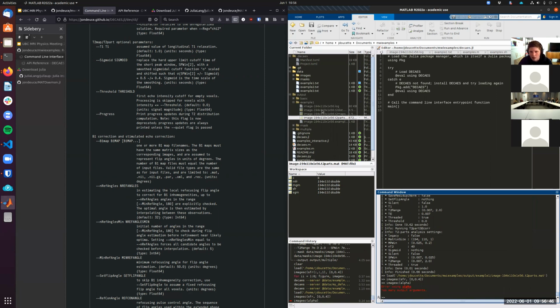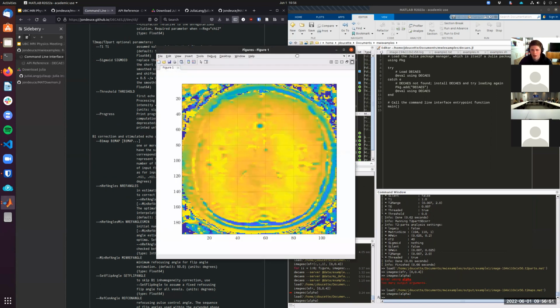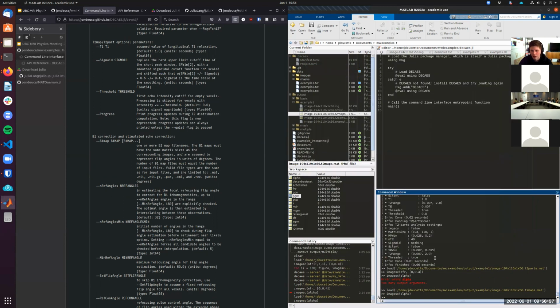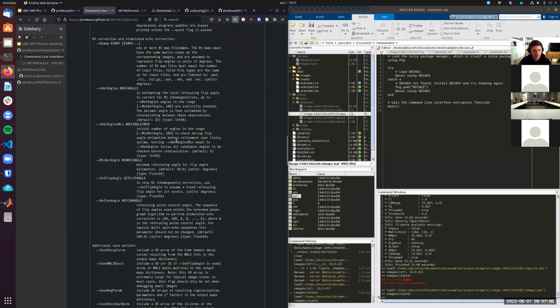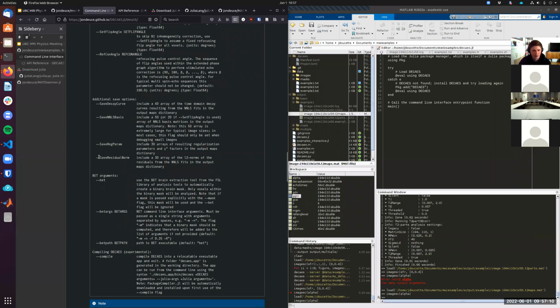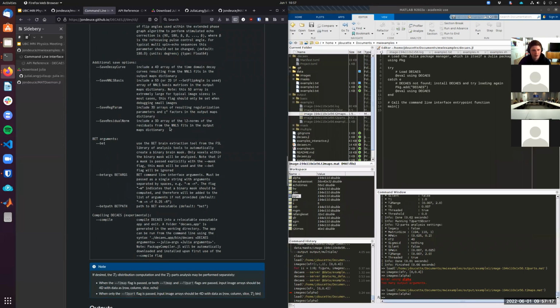Oops, I did not load it. So yeah, the flip angle map, if you have an estimate of this from somewhere else, you can pass that in, just as a regular file, so a PAR/REC file, a NIfTI file, a MATLAB file, whatever, just a 3D array of the flip angles. There are some other parameters for extra things you might want to save. For example, the residual norm, so that's how well the solution fit, the regularization parameter, things like that.